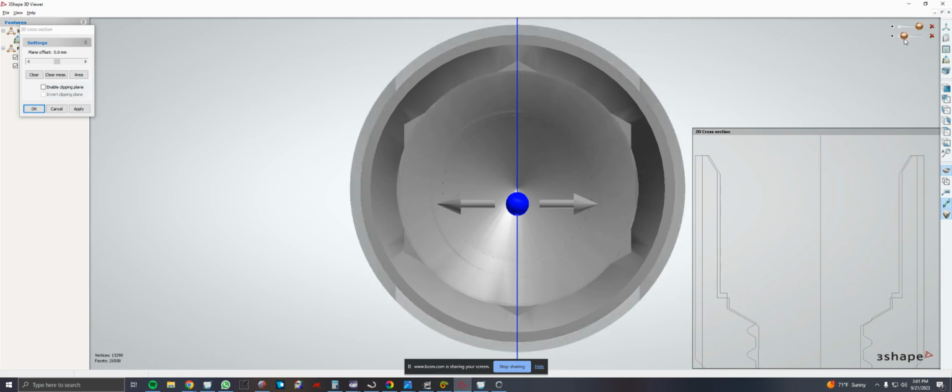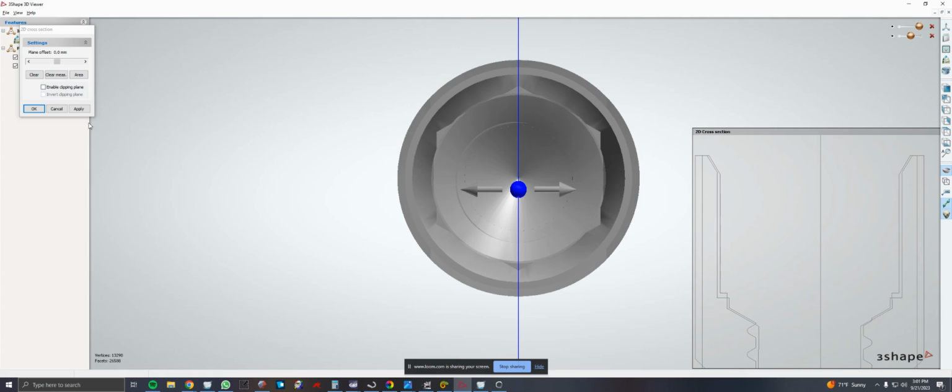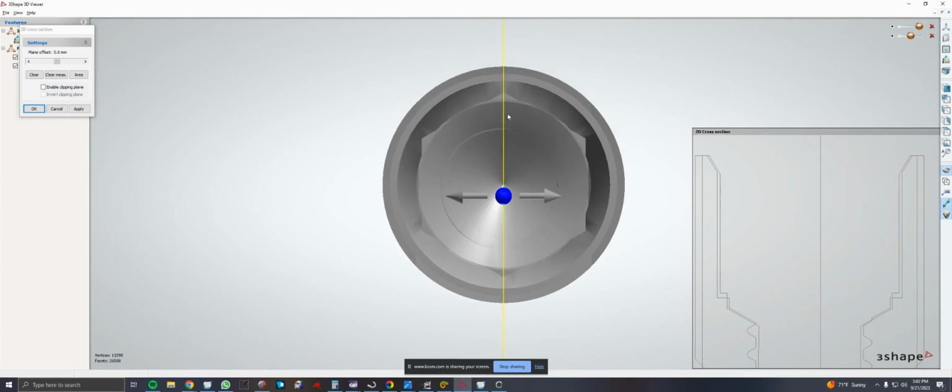The library sizes are going to be a little bit different. I believe DESS makes them not match one to one, but the position of the hex is right. Sometimes you'll see certain libraries are rotated 30 degrees relative to other ones. But because the DESS and the Tru ones are aligned to each other, this is a very quick and easy kit swap. We don't actually have to rotate any components.